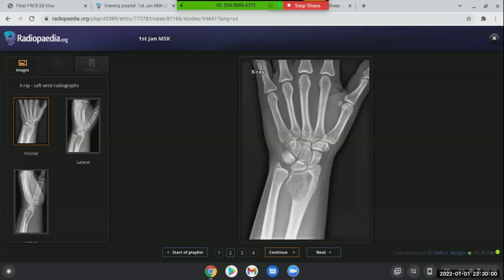Epiphyseal lesion, actually this lesion happens in a skeletally mature patient, apparently skeletally mature. So the lesion is reaching the articular surface. If before the epiphyseal closure and the lesion is happening in the epiphysis, I would consider the chondroblastoma rather than the giant cell tumor and the aneurysmal bone cyst. Otherwise, we have a list of the differential diagnosis of such lesions, including could be the fibrous dysplasia.